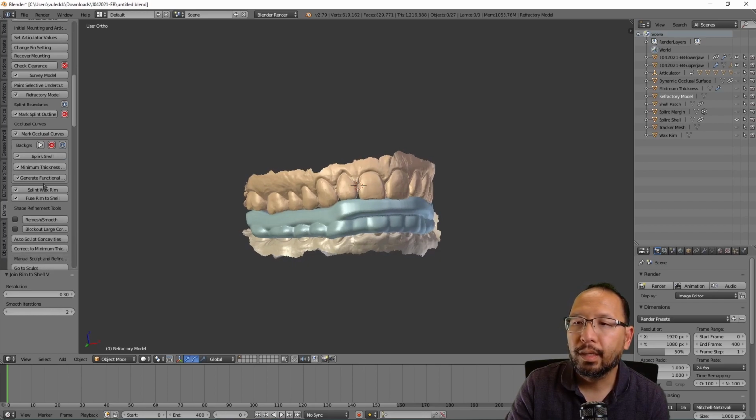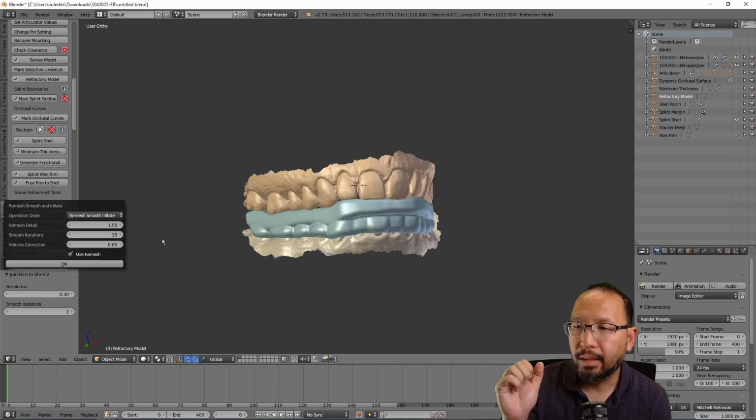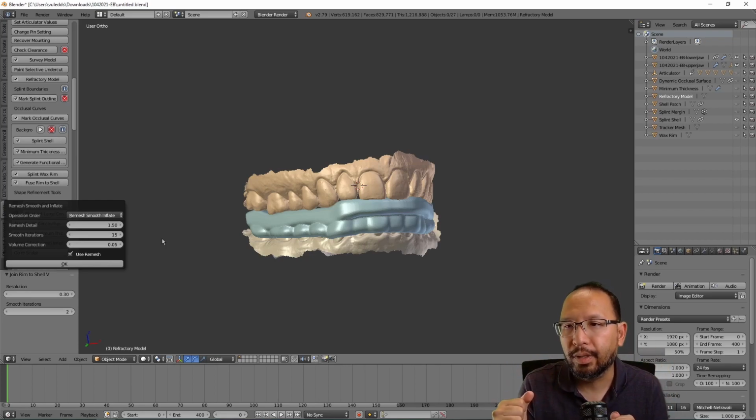Now they're fused. The next thing we need to do is click Remesh Smooth. Now the Remesh filter basically lightly puffs this fused model with kind of the equivalent of a flame on a wax denture. Kind of think of it that way. When you flame back in dental school, you did a little pocket torch flame and it smoothed the denture a little bit.